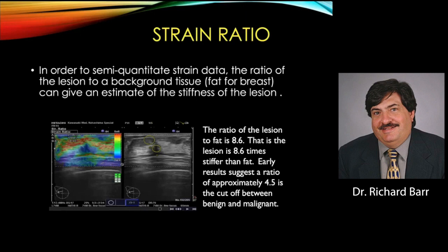So it's important that you know which scale you're using. So here you have a lesion. It's obviously bigger. That E to B ratio is greater than 1. It's bigger and stiff, so it would have a score of 5 on the 5-point color scale.